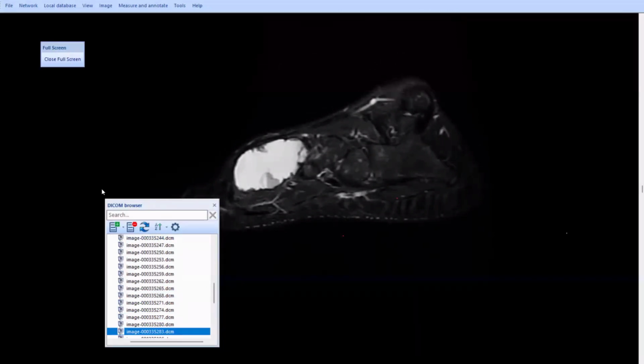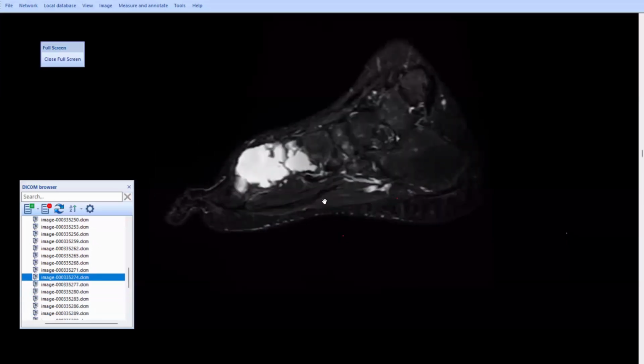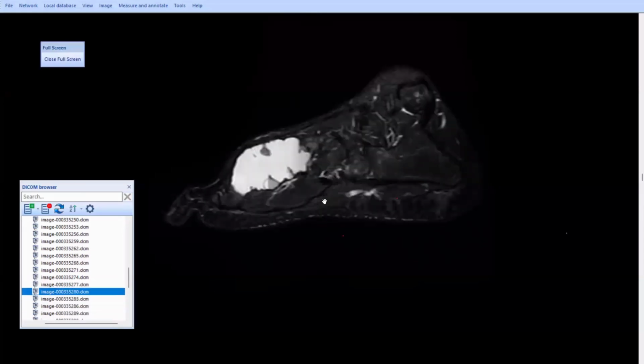This is a T2 fat-suppressed coronal view, I think without contrast, of the same patient. The lesion is showing internal septations. It is T2 hyperintense and is showing multiple fluid levels as well. I cannot appreciate that there is any breach on this particular image.